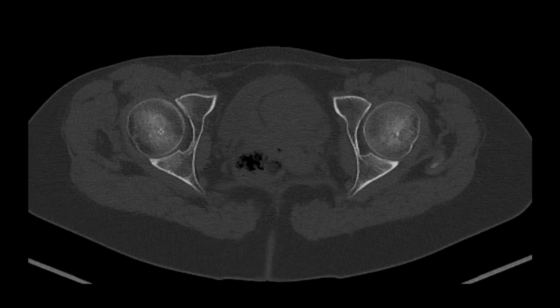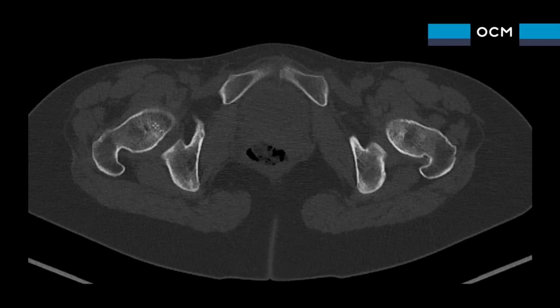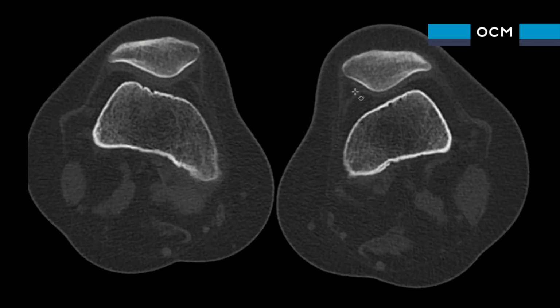So in this case we're using a CT scan from a lady with patellofemoral instability and clinical signs of excessive femoral anteversion. We start by identifying the center of the femoral head by drawing a circle of best fit. From the center of the femoral head, we then measure the angle between the femoral neck axis and an interconnecting line between the two ischial tuberosities, which is 25 degrees in this case. Alternatively, you can just draw the second line parallel to the lower border of your screen. So 25 degrees of femoral anteversion at the hip joint.